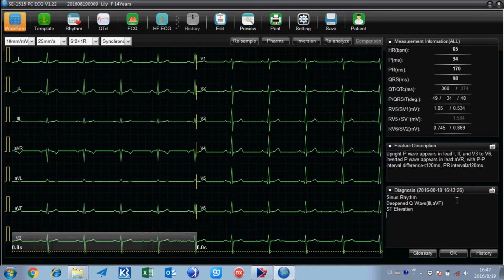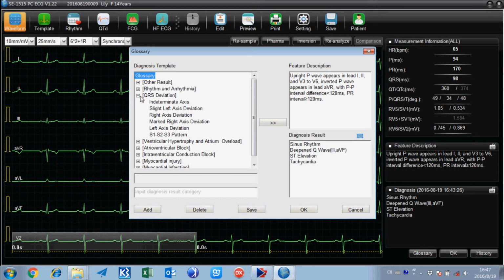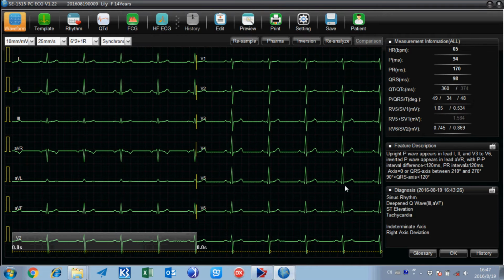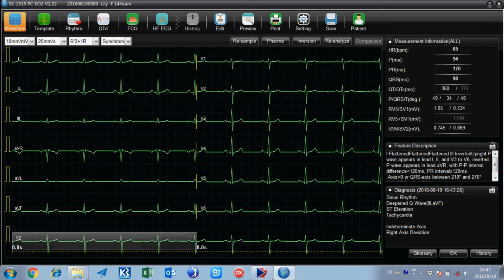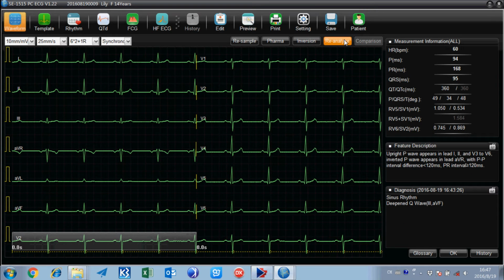Associating input and shortcut keyboards streamlines the workflow of the conclusion modifications. Meanwhile, you may also press the Reanalyze button to regain the auto-conclusion.